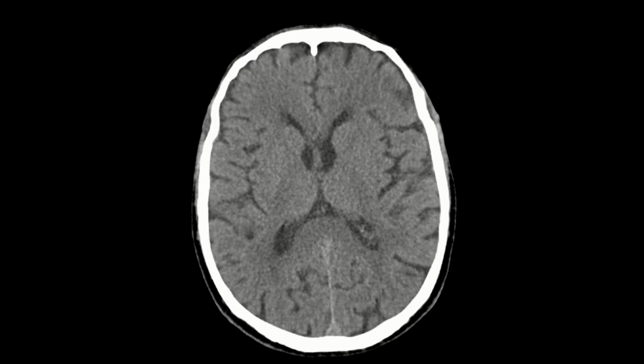So this insular cortex is important in the setting of an MCA infarct. That's an infarct involving the middle cerebral artery territory. In CT, you usually do not see any significant changes in the brain parenchyma in the setting of an infarction for quite some time. But in the setting of a suspected MCA infarct, you can rely on two signs, one being the insular ribbon sign and the other the dense MCA sign. We'll talk about the former right now.